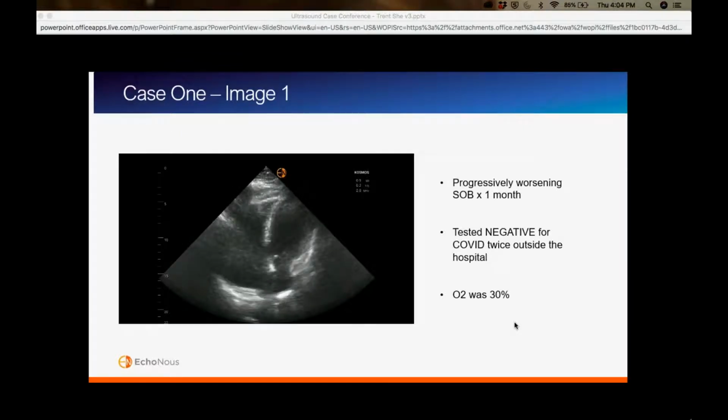Yeah, and I like that you started off with the apical 4, which is great because we can see the chambers, we can compare the chambers to each other. If you're concerned about this acutely hypoxic patient, usually our first differential in most patients is going to be PE. Obviously now we're caring a little bit more about COVID, but we're going to be thinking about that. And this view is really nice to get a great look at the RV in comparison to the LV.